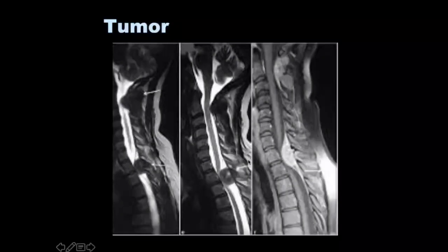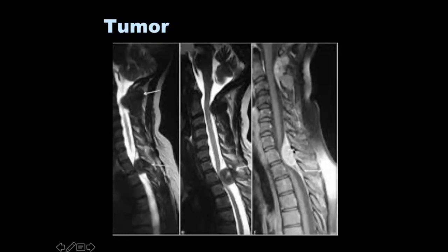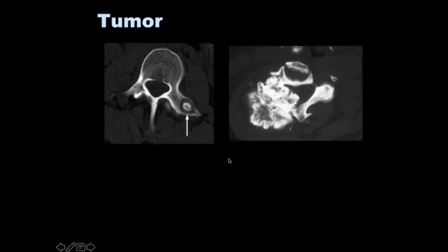And then this is an extramedullary tumor, causing meningeal enhancement and causing compression of the cord. So again, referral to the neurosurgeons.